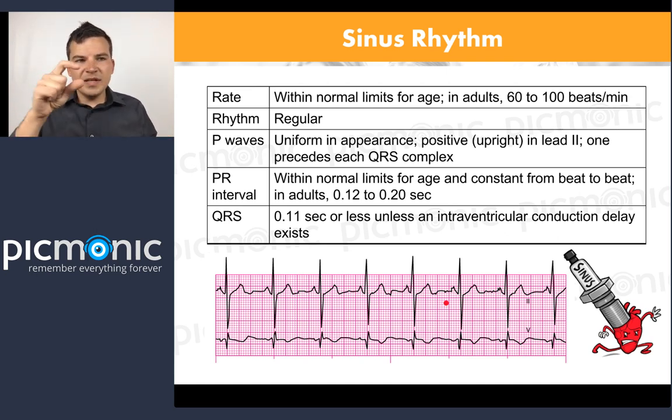It's a little beat that's just going to be a little bit off place. That's perfectly normal. If you're seeing it slowly speed up, just a little bit over a couple of beats, perfectly normal. I think I have an example here to look at.